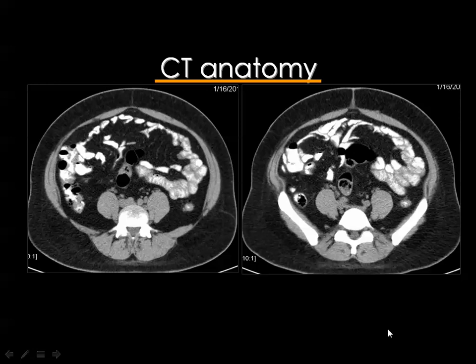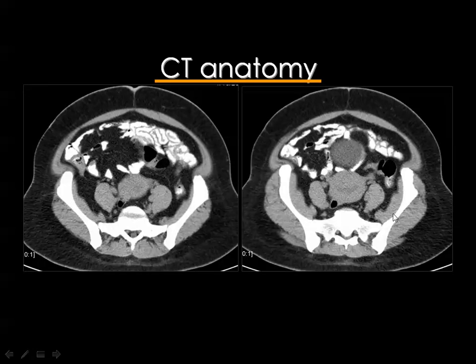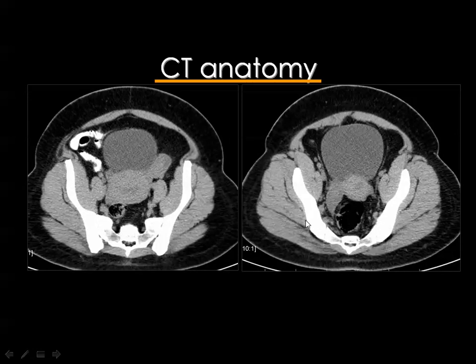of contrast material. At the level of the iliac crest, you see only bowel loops and some of the vessels and the iliopsoas muscle. And going into the pelvis, first you will meet the fundus of the uterus, then you will see some part of the urinary bladder, and lower down you can see the uterine cervix, which is located between the rectum and the urinary bladder.